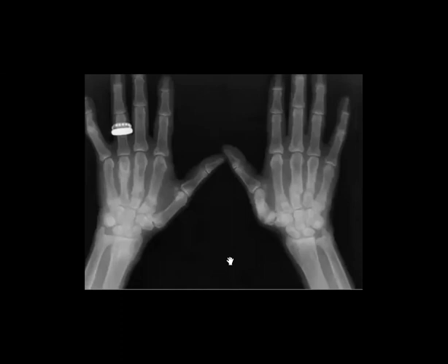Yeah, that osteomalacia has no effect on the growth plate, and the age. Rickets is usually in children, but both are due to vitamin D deficiency. So when it affects the growth plate, you can think about rickets. The non-specific criteria of osteomalacia are that you find osteopenia, and maybe some coarse trabeculation, okay?